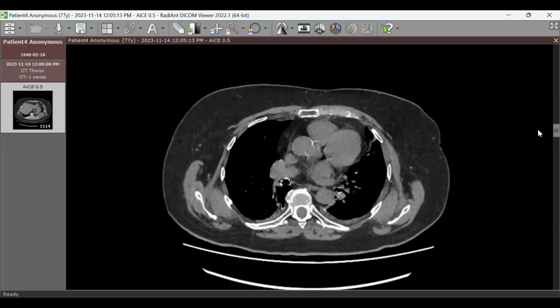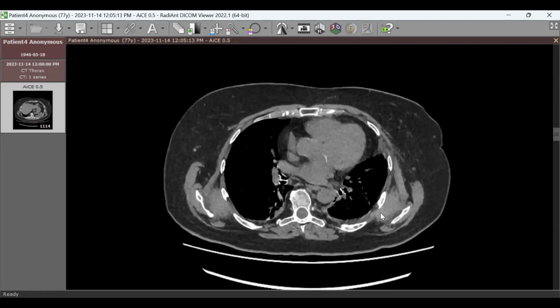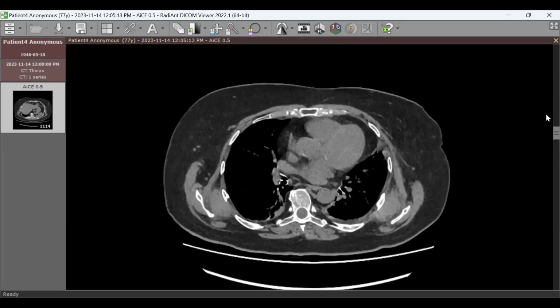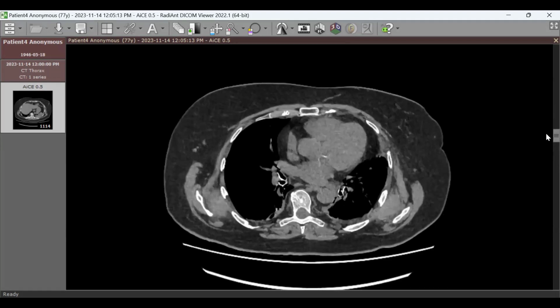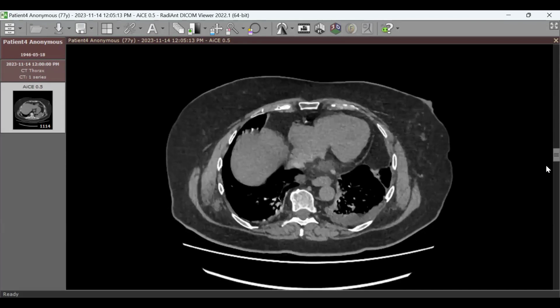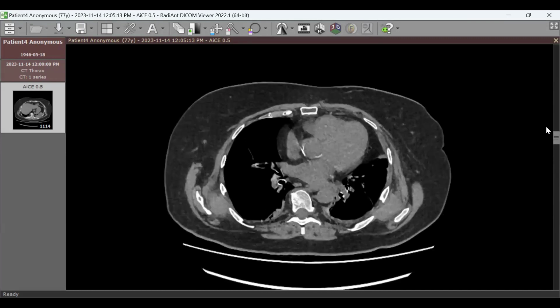You're right. Sometimes you can see that they have nearly skeletal muscle density, and they are ill-defined on the periphery, and there is some interspersed fat that you can also evaluate on MRI, and sometimes they slightly enhance. Also, sometimes they could have a faint uptake on PET-CT, but that shouldn't worry us because they are totally benign. As you said, more in females, like 5 to 13 to 1 versus males, and in the 60s and 70s, old age. And they're related to the continuous friction of the inferior scapula with the posterior chest wall.